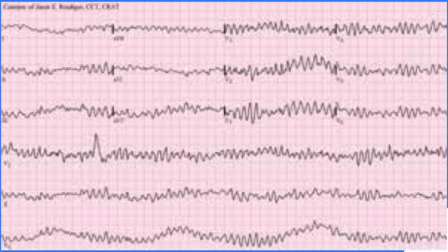This is again ventricular tachycardia with some runs of torsade de pointes. When you find the axis changing, those are the torsade de pointes. So you would find high amplitude and then lower amplitude QRS complexes. And all of them are large, bizarre, widened, disorganized, and dysynchronized.